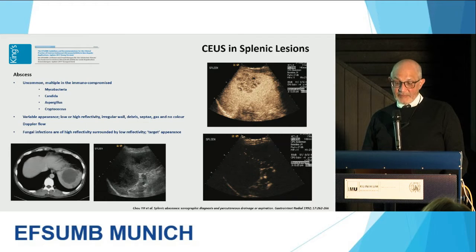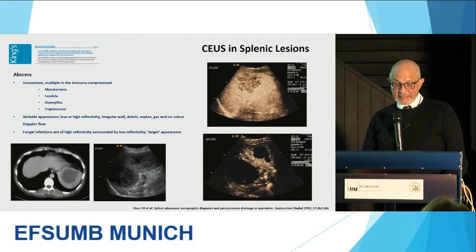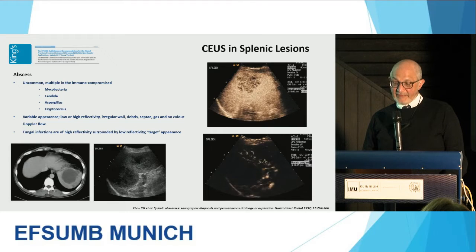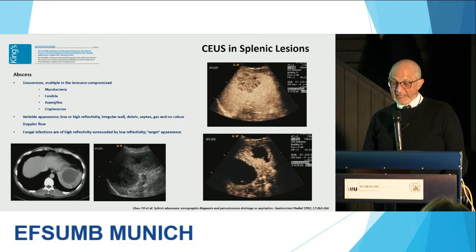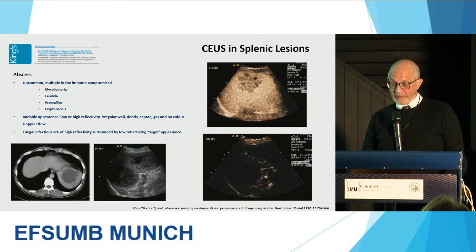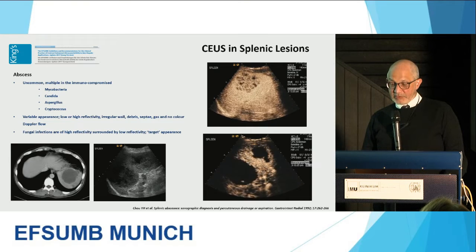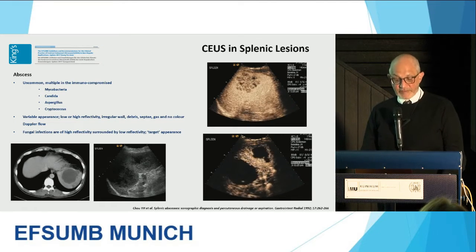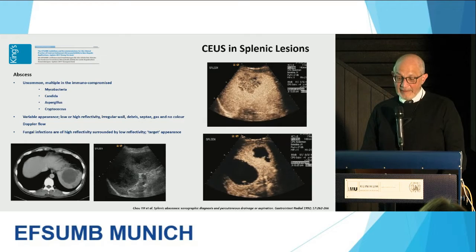An abscess is not that uncommon in the spleen, and you will see it in your practice. Depending on the age of the abscess and the liquefaction, you may get these sort of appearances where a drainage procedure would not be suitable for an abscess. But this sort of appearance where there's liquefaction in the spleen would be amenable to drainage if clinically indicated.